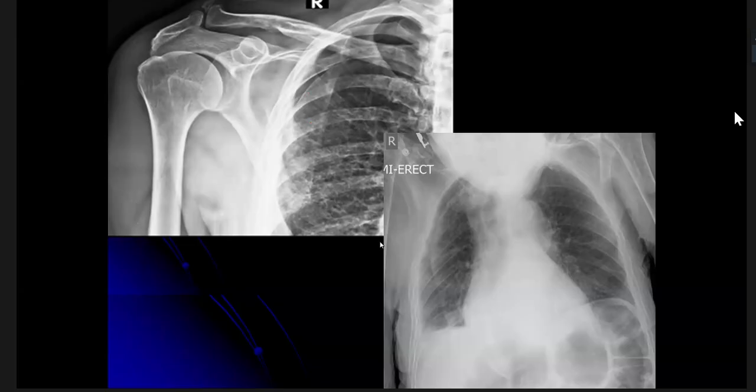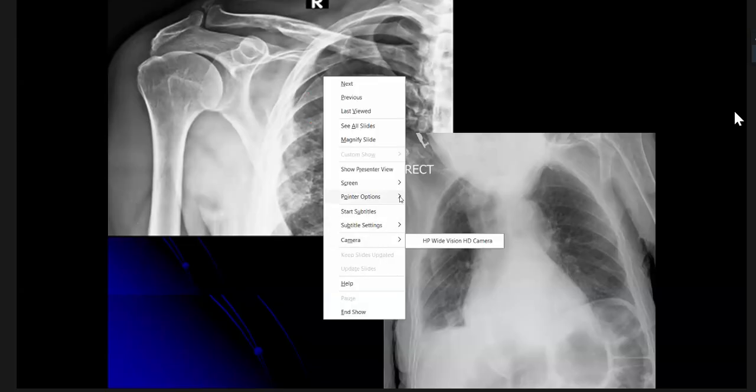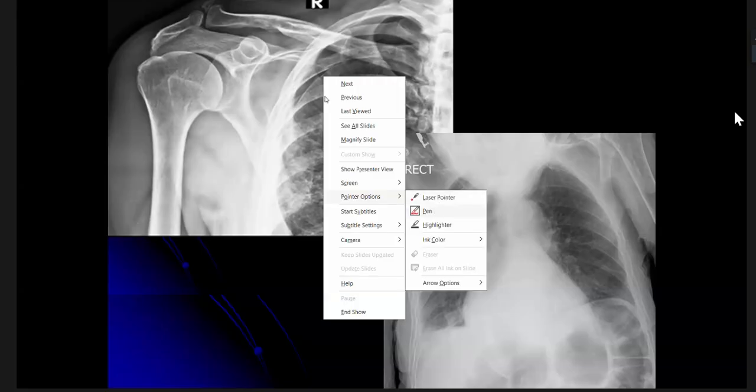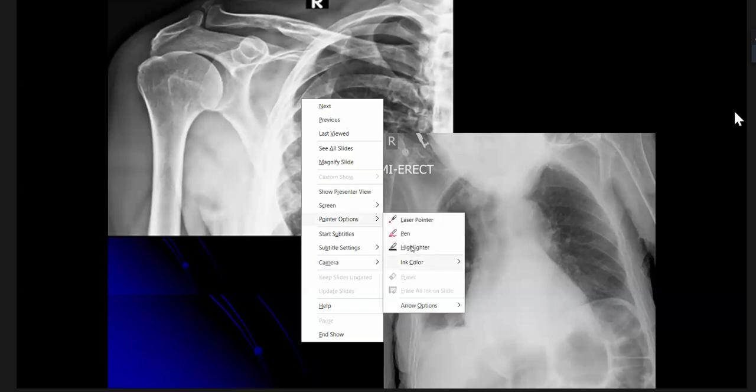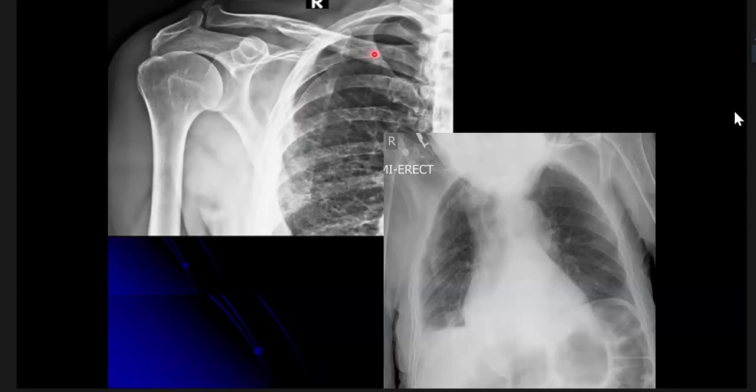If we think these are the pleural lines, correct? Yes, sir. As per you, this is the pleural line. So what is the most important thing we see? Sir, we have to look for absent bronchovascular markings. Very good. Excellent, Dr. Deepak. So you are seeing there are absent bronchovascular markings here. What about this?